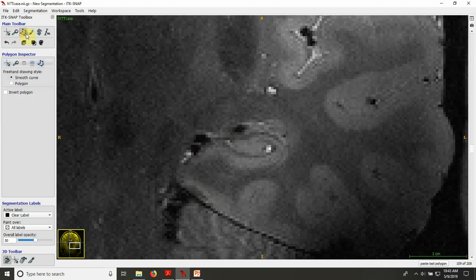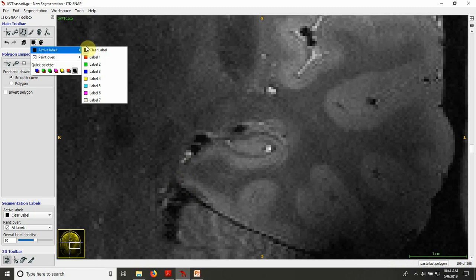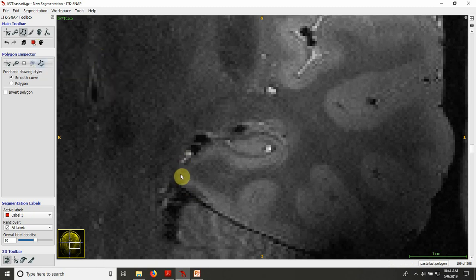The way we determine the border with this region is we first draw this line and try to find the most medial point of the white matter, then try to find the most medial point of the gray matter, and then connect the two dots, and that would be your border between the hippocampus and the adjacent cortical region. So I'm actually gonna start by outlining the whole hippocampus. So I'm gonna again use the points that I just indicated.